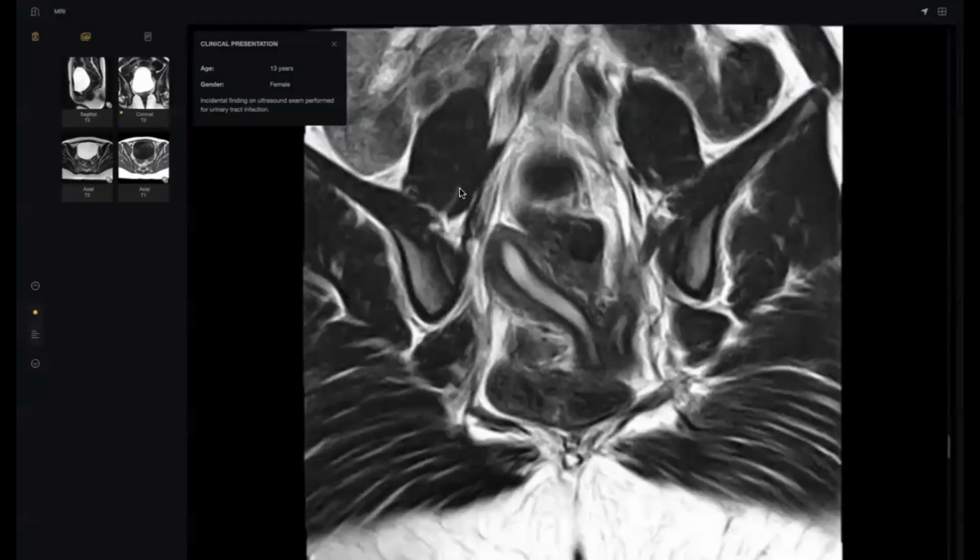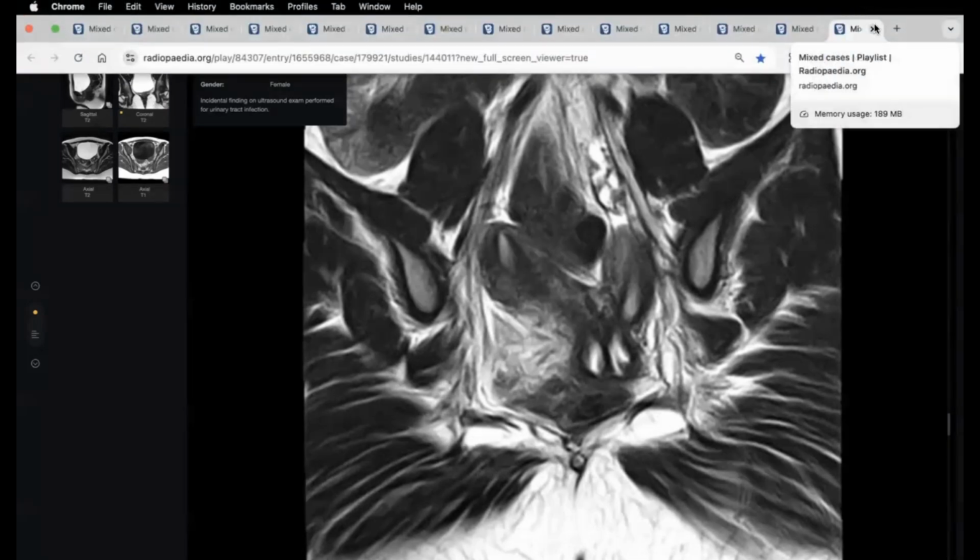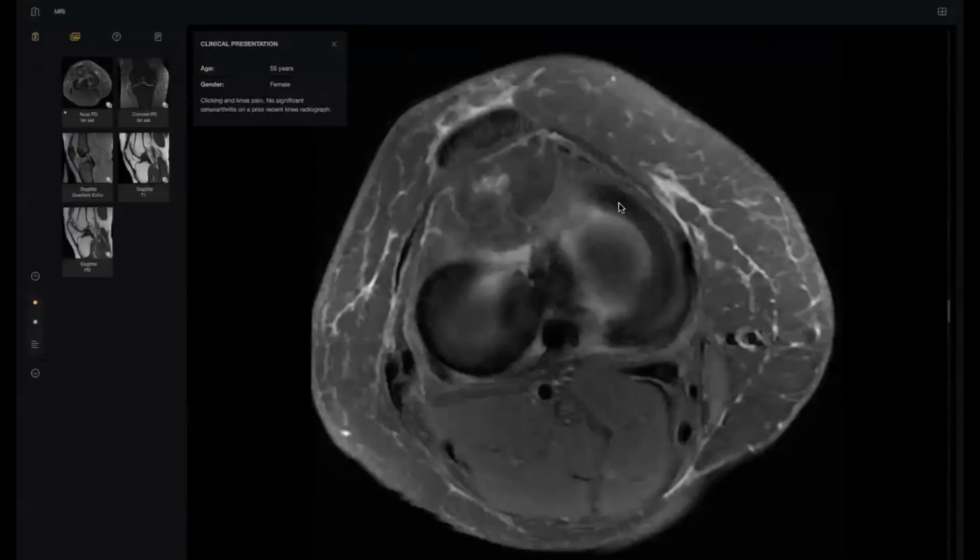Here you can also use the coronal. This is right to ask really for axial and coronal, but I'm showing you how to detect it from the sagittal. Next step is to do ultrasound of both kidneys. Thank you, doctor, so much. Next candidate.